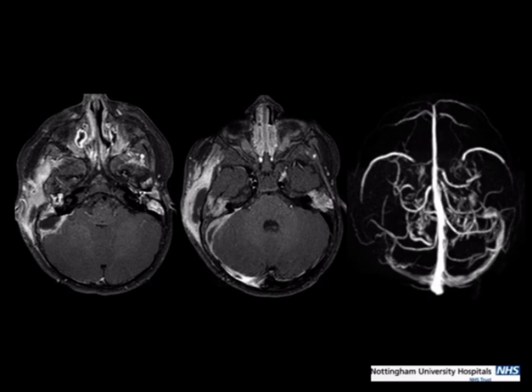But further up, in the area where we saw the high density on the CT, you can see this sausage-like low-signal filling defect in the right sigmoid sinus, consistent with secondary thrombosis from this infection. And obviously, unsurprisingly, there's absent flow on the MRV.